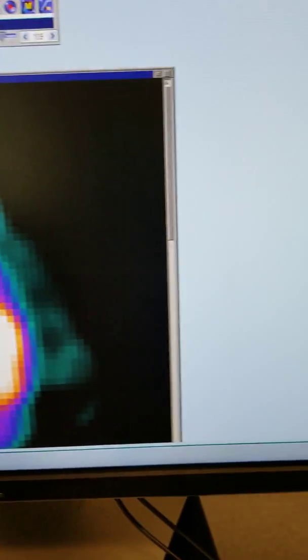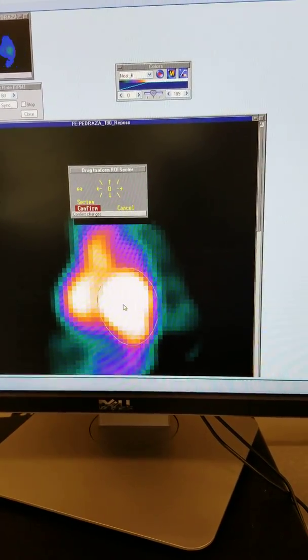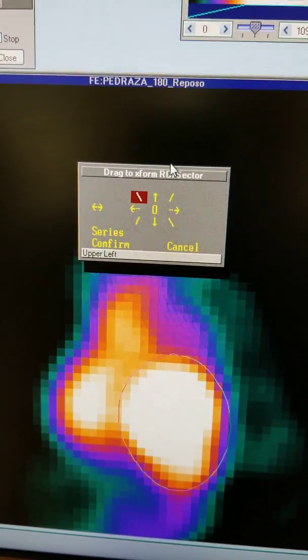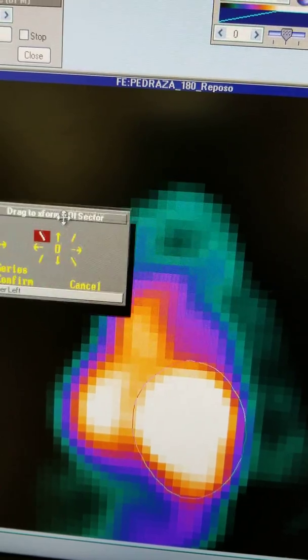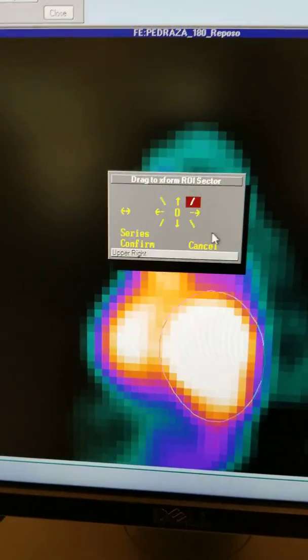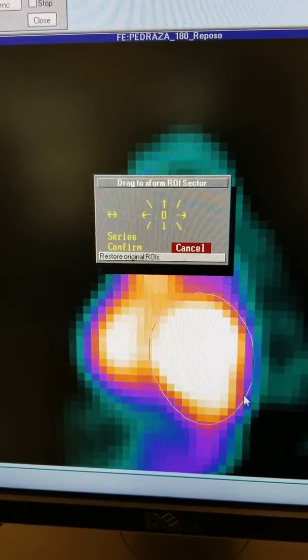So once we've done this, hit my Alt button. You hold down the Alt, either one, left or right, doesn't matter. And then you click with your left mouse button. Pulls up this window. You can drag it around. Stop window. I'm dragging you around. Alright, now to make this work, so if you see, I've got a little bit of blue here.